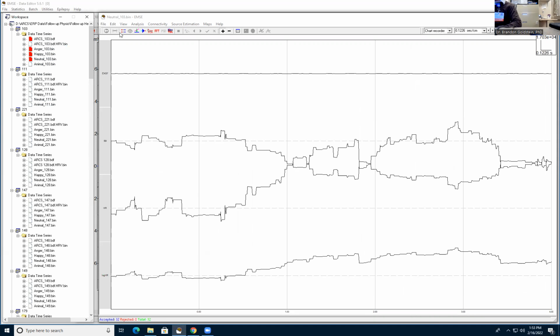That's how you batch the heart rate data, and also that important intermediate step where you make sure that you run that script outside, that you do through this dialog, and it's kept in those text files. So that's an important intermediate step, which is sort of unique to the heart rate processing. All right, happy processing.